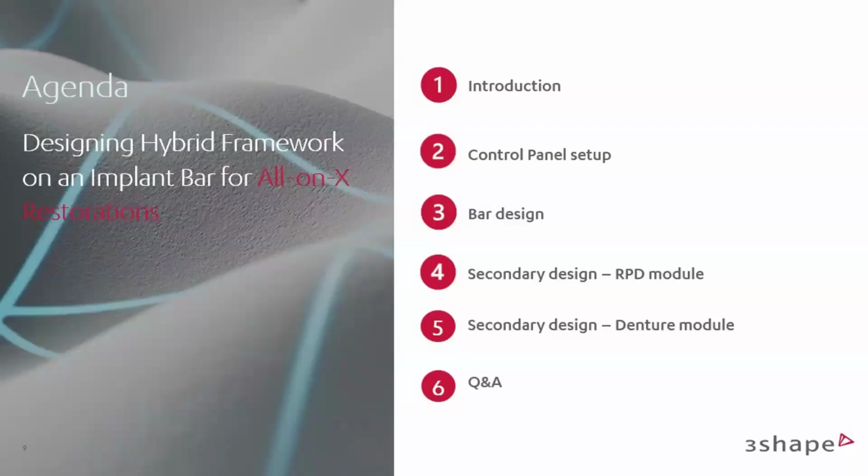This one is newer, but since the denture module has been growing and developed very actively throughout the last few years, that is the alternative module. And both of them have some pros and cons. I will try to emphasize them.